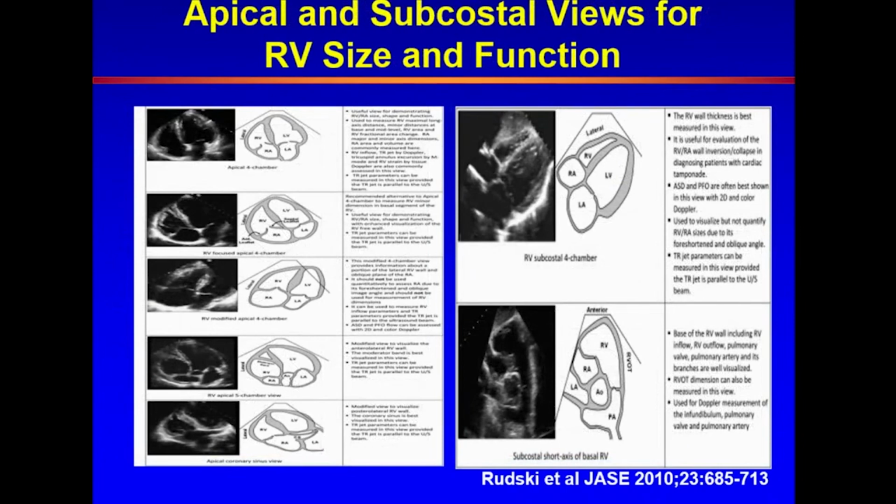You would appreciate, I hope, through what we've been talking so far, is you get to see the RV from multiple windows. That's the tomograms that we get, and at the end, whoever is reading the examination and whoever is scanning first should form an opinion, a final summary based on what they see, because we do not see the whole RV in any of the views.